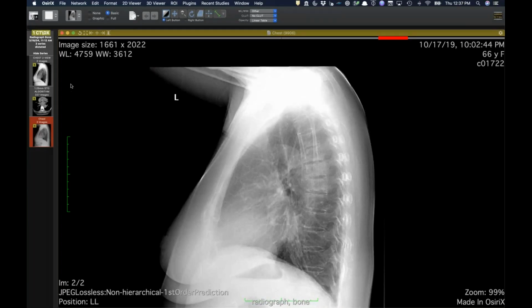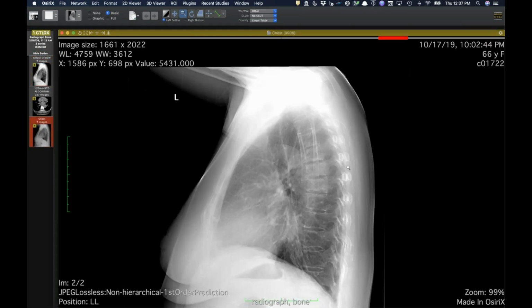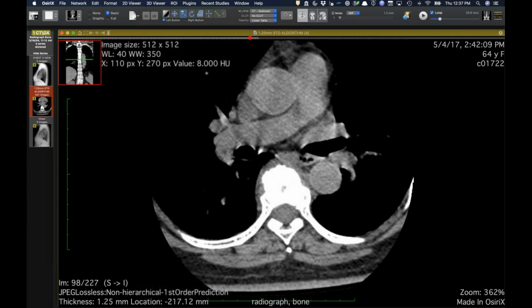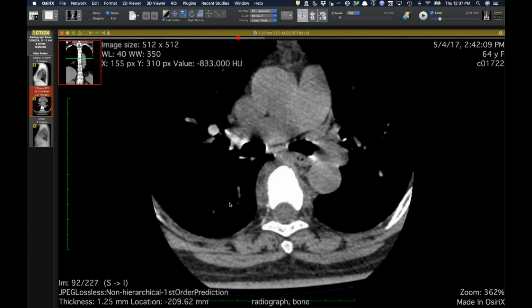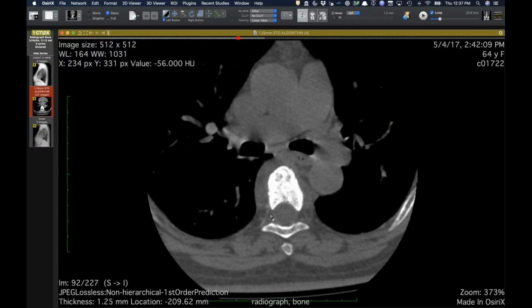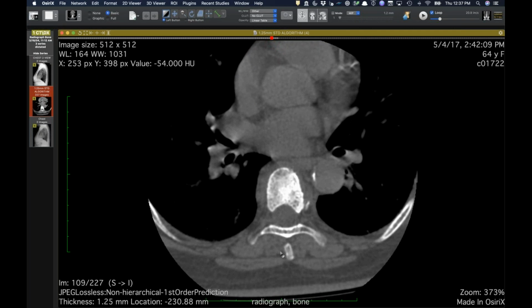But I thought this was just an interesting one, based on this is what jumped out at me on the lateral and got me looking back through everything else. So what do you think? You think that the soft tissues that are surrounding that are hypertrophy are just part of the inflammatory response? It's sort of an extra-articular inflammatory component? Yeah, I don't have a better explanation. I don't know if anyone else has some bone experts they can show it to. But yeah, I think it's probably some sort of proliferative arthritis.